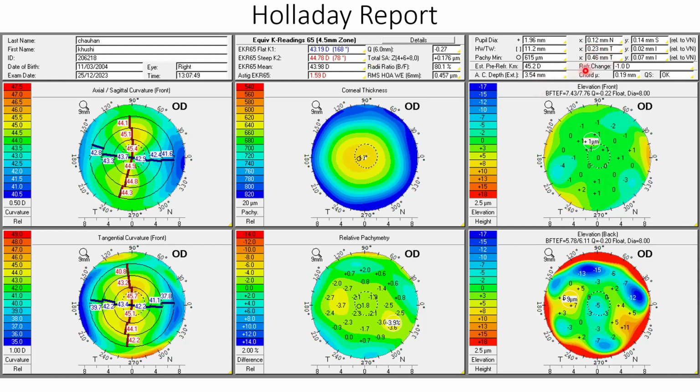It also mentions the chord mu. Chord mu is nothing but the difference between the visual axis and the pupillary axis. In other terms, it is also known as angle kappa. So if a chord mu value of more than 0.42 is seen, it is shown in yellow. And if we use multifocal IOLs in such patients, we should be wary of glares and halos.